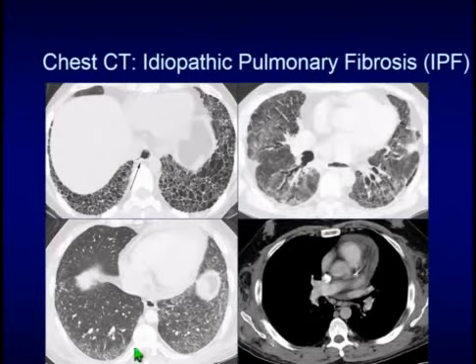On the bottom, we see more ground glass attenuation, and you see that there's a lot more ground glass than the reticulation that we see here. And again, it is a subpleural predominant disease, and not much honeycombing, as you can see. And on the soft tissue windows, look what you see, a little pericardial effusion, and you see soft tissue calcification. So this is a patient with dermatomyositis with lung disease, again, path-proven UIP.